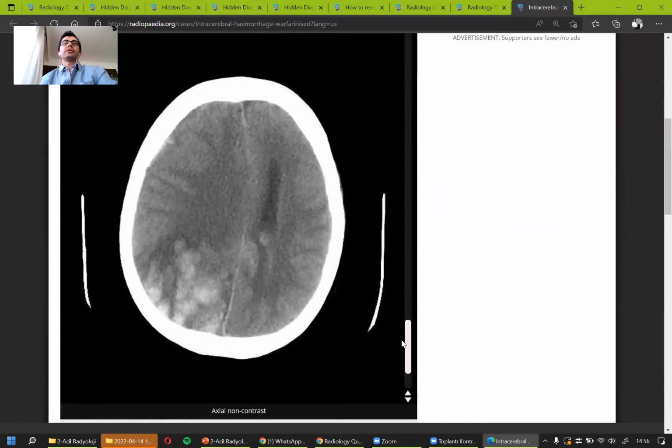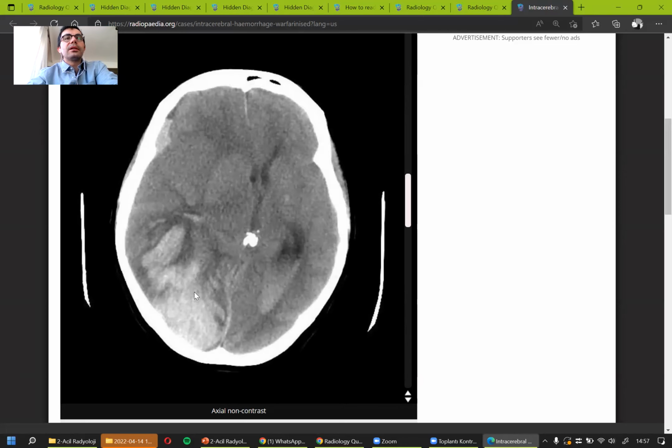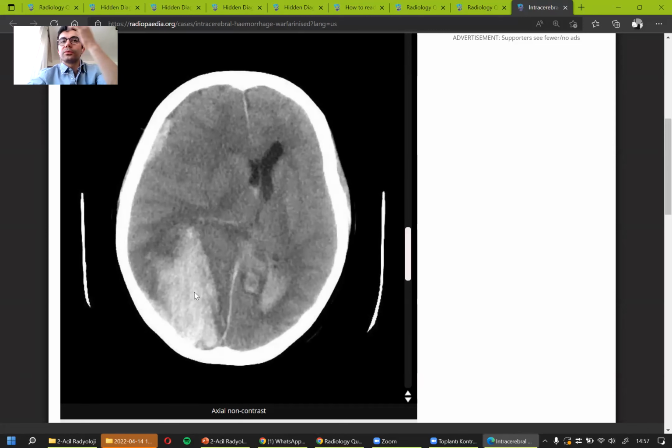So when I look at this patient, first of all, I don't see the sulcus, right? The gyri are here, the cerebral parenchyma is here, but the sulcus is not present, as you see. And when I go down, I'm seeing that the lateral ventricles are looking asymmetrical, right? So the midline is shifting towards the left side, and I'm seeing something pretty bright on the right occipital and parietal lobes here, which also has a hazy appearance, and looking at the brightness level, it is pretty bright.